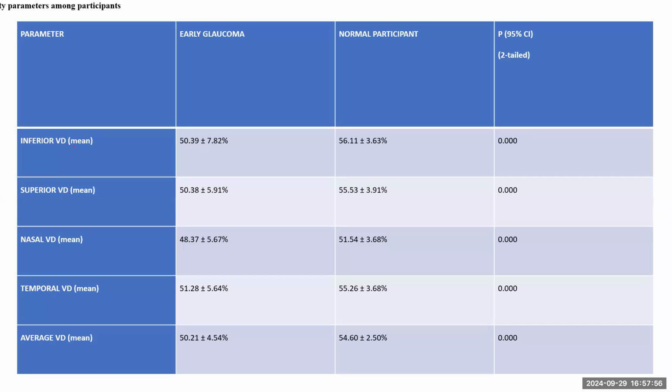Although for Caucasian eyes, 50 is normal in some of them. And there are other slight variations, like in high myopia, it could be lower and all that. So I will take us back to the results so that we'll be able to put some figures in mind. If you want a random figure, it's usually 50-51 for normal. That's for quantitative. The qualitative is a decision of the physicians.